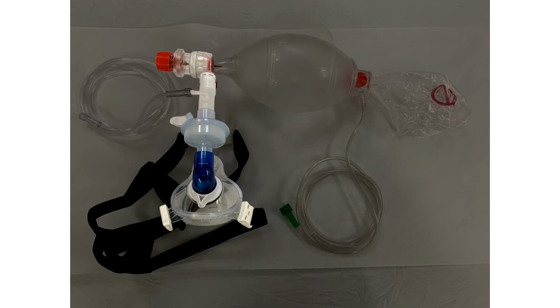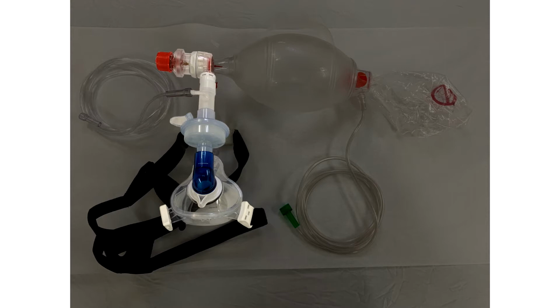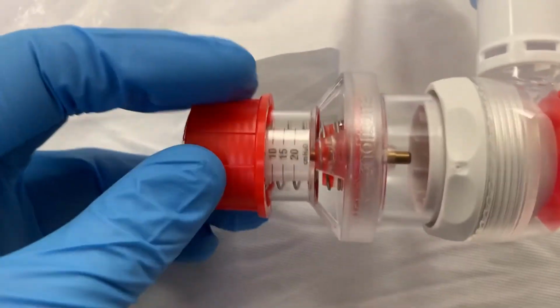The distal portion of the setup is the part that has been changed the most. This portion must have a PEEP valve, a viral filter, and a source of oxygen. When the patient exhales, this system becomes a closed system as the second valve closes. This PEEP valve is essentially a pressure-based valve that only allows gas to escape past a certain pressure in the system. Most PEEP valves go from 5 to 20.